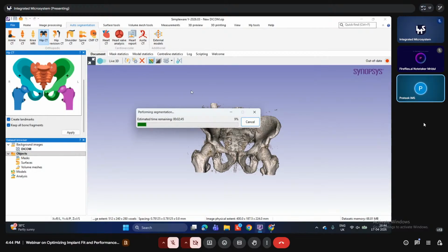We have seen the manual segmentation, but we have not split the regions. But in the automated segmentation, there is no requirement of pre-processing. There is no requirement of the crop tool. There is no requirement of any other filtering option, any other 3D editing option to remove any specific part. It will remove all the unwanted parts, and it will directly generate our structure like this.